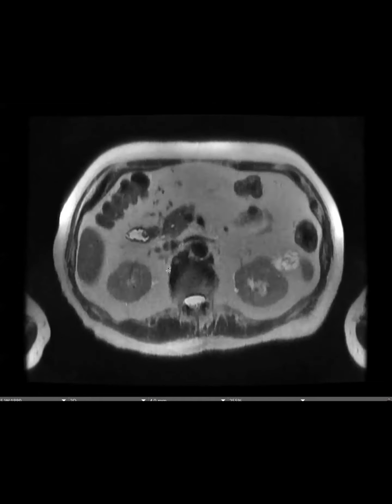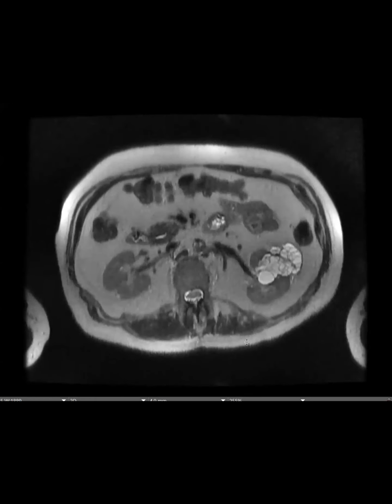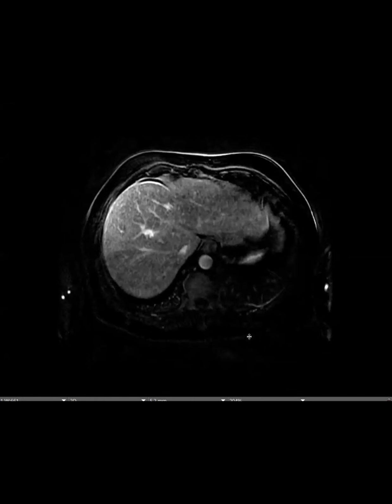So this is a patient with a left renal cystic mass. What do you think? It looks like it's herniating into the renal pelvis. So I'm thinking multilocular cystic nephroma, which is now called in the MEST spectrum. MEST, yeah. That's benign, right? Like totally benign, isn't it?